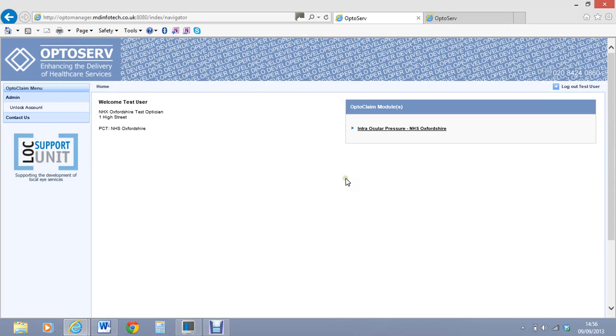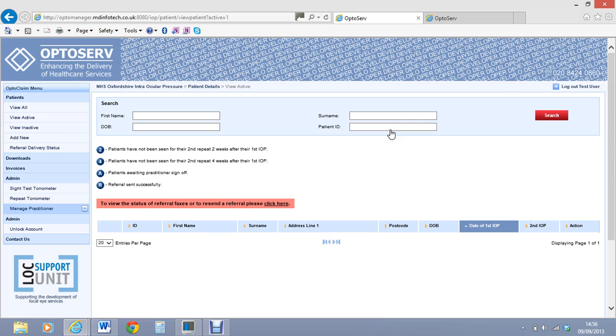This is chapter 3, and in chapter 3 we're going to look at our one and only OptoClaim module, which is the intraocular pressure module. In this chapter, I'm just going to run through a basic outline and the initial setup of the intraocular pressure system. So you're in there, simply click on intraocular eye pressure and that's going to take you through to this module. Now each module is going to have a similar structure to it, but will be slightly different really.